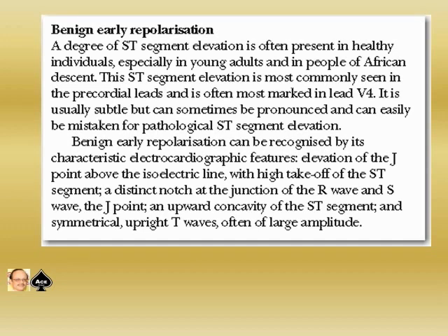Benign early repolarization can be recognized by its characteristic electrocardiographic features. There is elevation of the J point above the isoelectric line with a high takeoff of the ST segment, a distinct notch at the junction of the R wave and S wave, the J point, an upward concavity of the ST segment, and symmetrical upright T waves often of large amplitude.